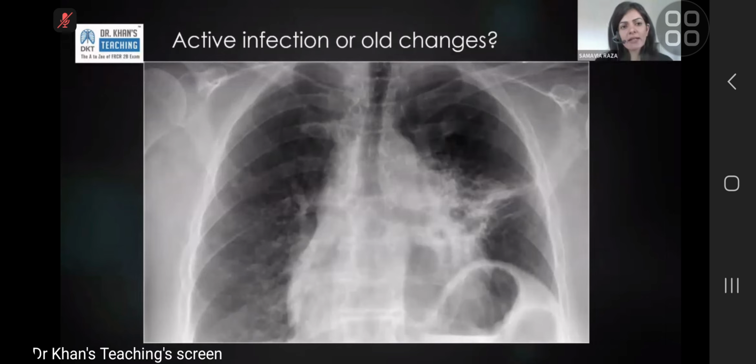So coming to infection, is it active or is it old? If you don't have an older film to compare to, it's slightly hard. So look at that X-ray and give me a few clues of what you think. Is that an old infection or a new infection?